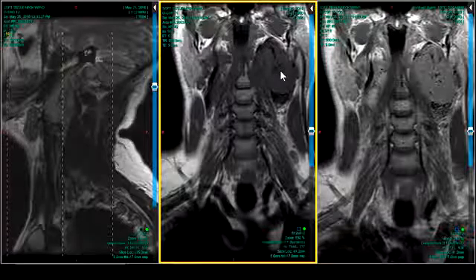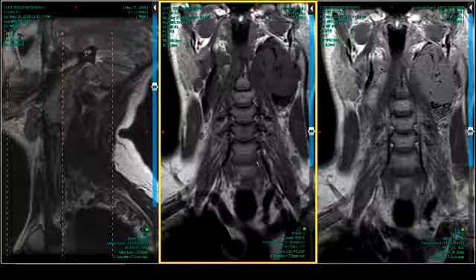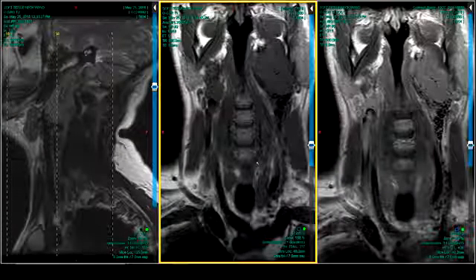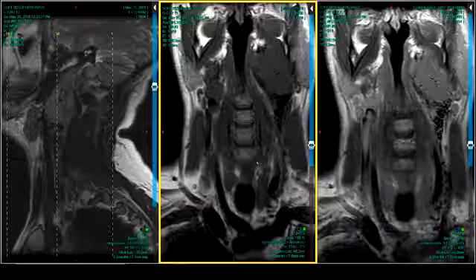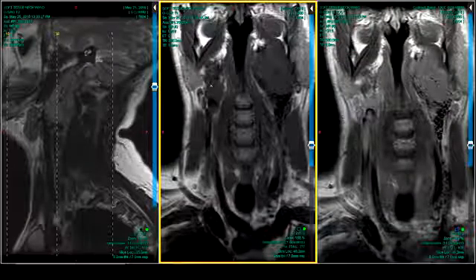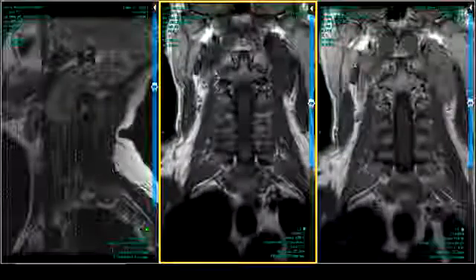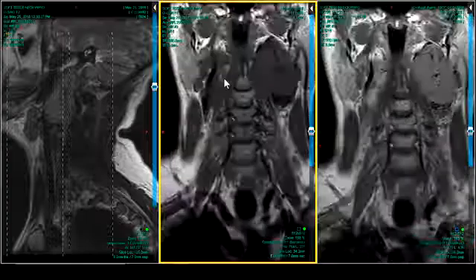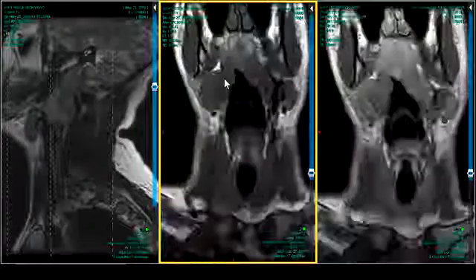This one is obviously none of those other than vascularity. It has to be vascularity. And hopefully you have dialed into the fact that there is one on the other side, or something on the other side. Let's keep looking, shall we? Or maybe something else on the other side. It's getting a little more convoluted.